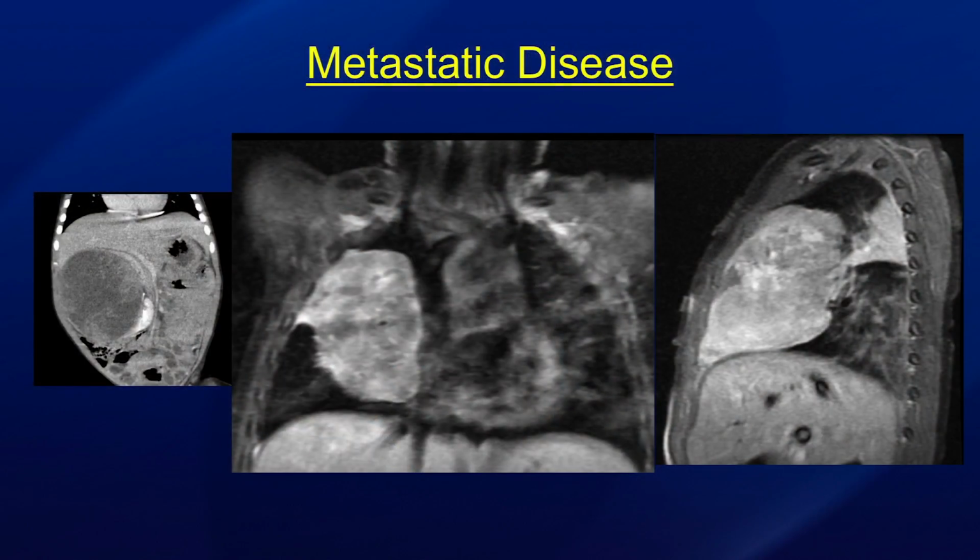Metastatic disease. We're seeing it more in kids. More and more people don't do CTs in kids, and they'll just jump right to MR. I'm always amazed. I'm like, where's the CT? Because we still do a fair amount. And it's like, oh, we don't do CT. We just go right to MR.